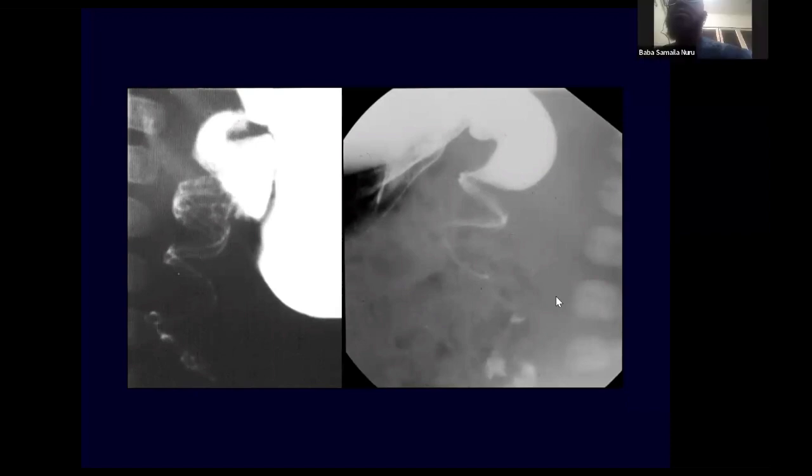So it's important not only to take an absolutely straight AP view to look for the DJ flexure, it's also important to take a lateral view to look at the character of the duodenum, because I think these corkscrew signs and the beak signs are more easily visualized when you're looking at the baby laterally.